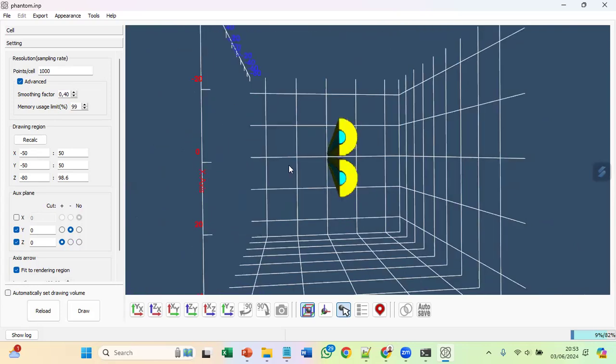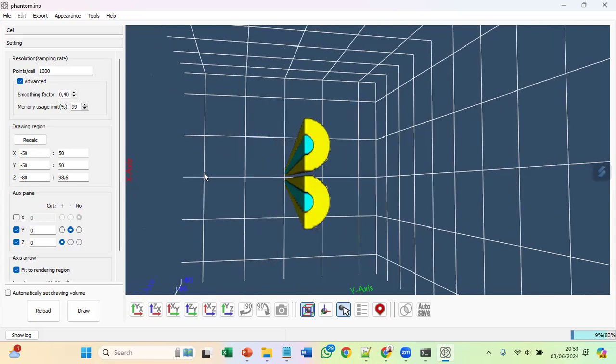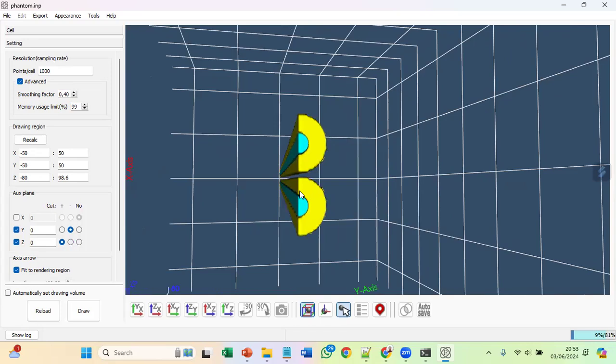After this, we are going to create a very simple cancer, and I will explain why I pick some numbers for those cancers. Do you have any questions?